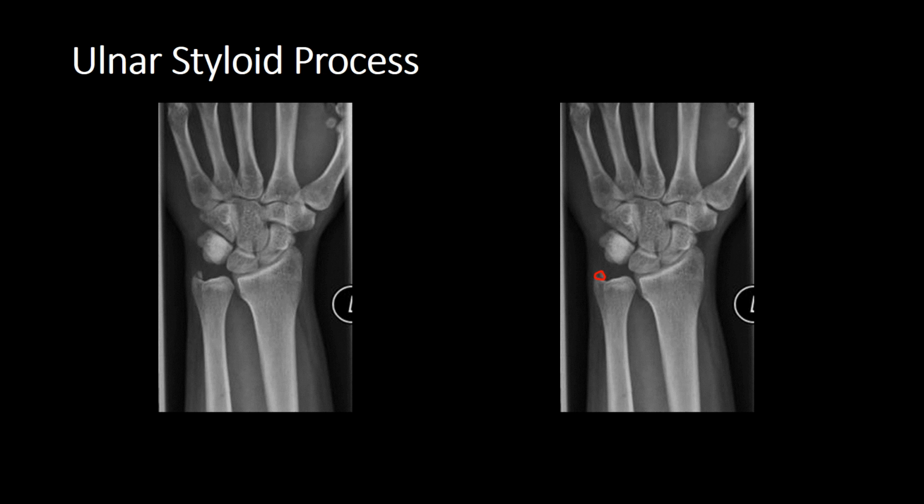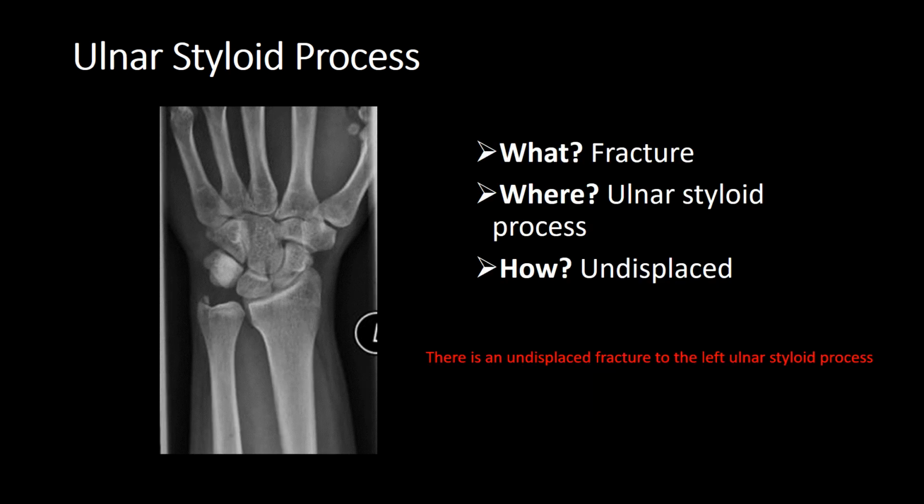So what is it? It's a fracture. Where? It's the ulnar styloid process. How? It's undisplaced.